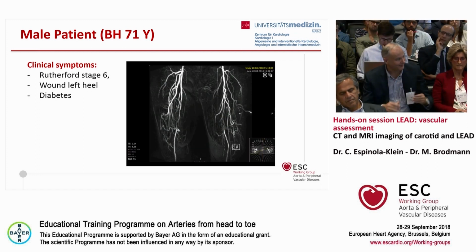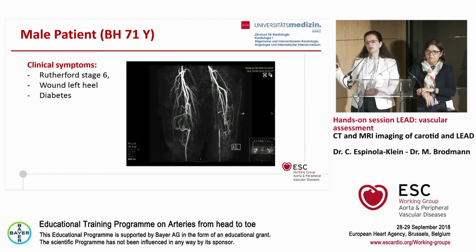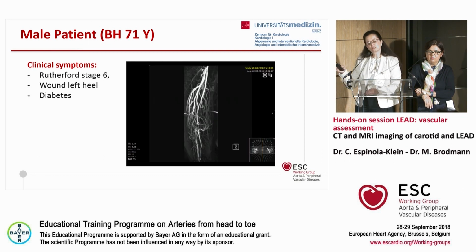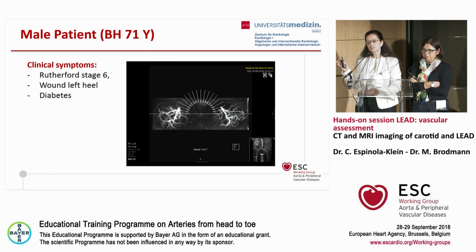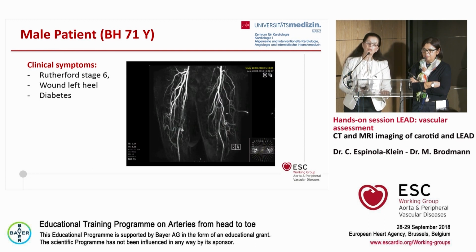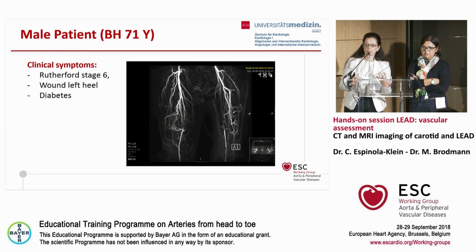The problem of Doppler ultrasound in this patient is that the flow below after the occlusion is slower. And it's not so easy in a patient with diabetes, and in this case with medial sclerosis, to see in a very clear direction the lower limb arteries and to make decisions. That's my experience in this case.